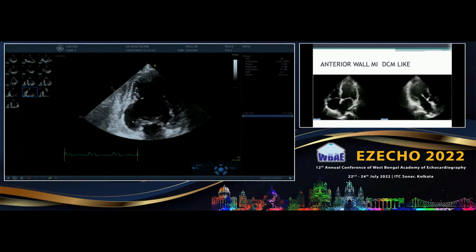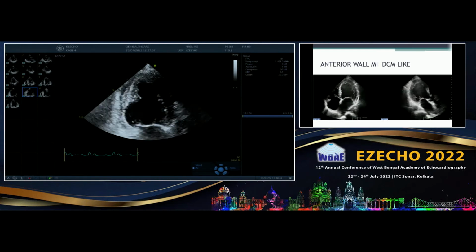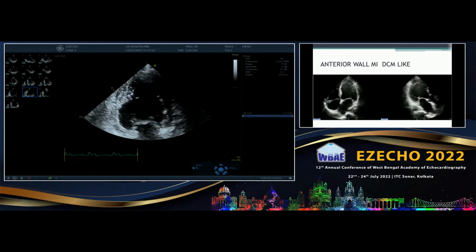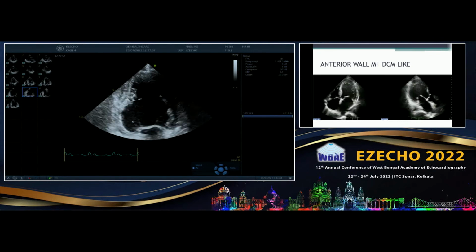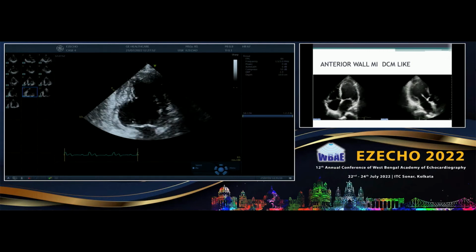Though this is moving, I am calling it akinetic because this is not having systolic thickening. Because I know how is the systolic thickening, there is a comparator there. So this movement is called a tethering motion. The second thing is another motion which is called the translational motion. That means this LV moves in and out of your imaging plane. Now suppose you are in a long axis, or you are in a short axis. If the image moves across the imaging plane, you know the LV is tapering on either side.